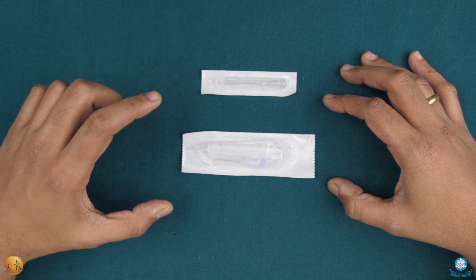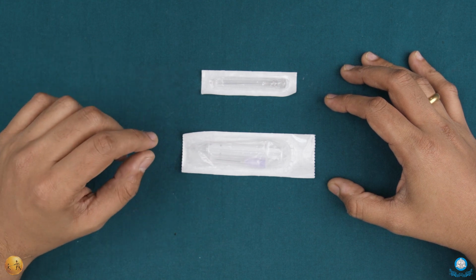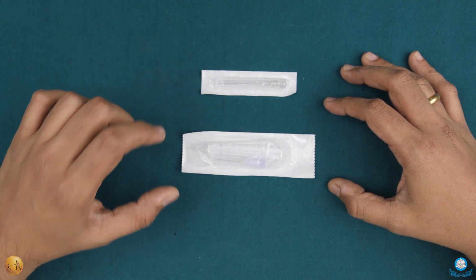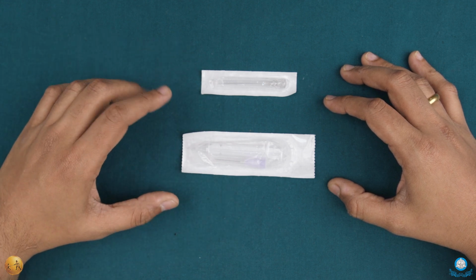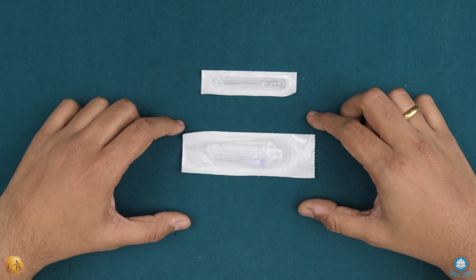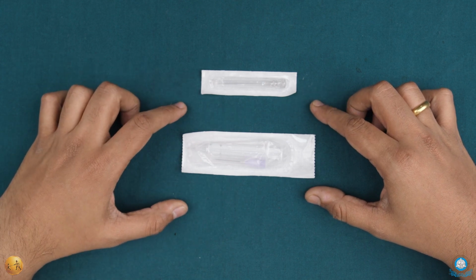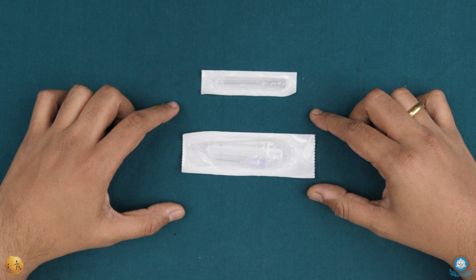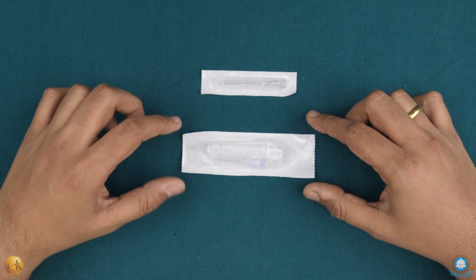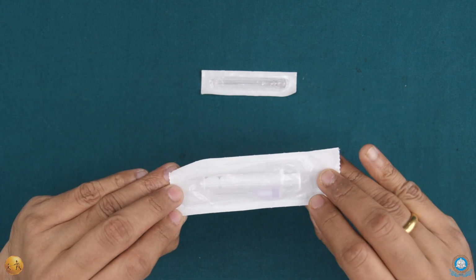Now a vial is a multiple dosing packaging wherein multiple times you can withdraw the drug from the packaging itself, that is the bottle. This is exactly opposite to the cartridge system. Now the cartridge system is a single dosing packaging which is analogous to an ampule, which is a small glass bottle. Now with that in mind, let's first start out with the actual disposable syringe.